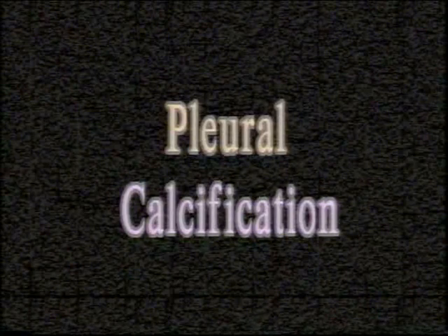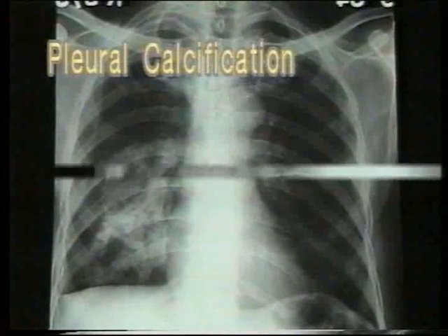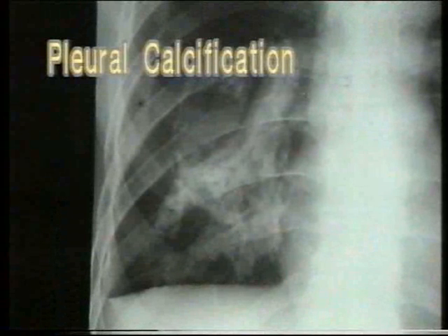An after effect of a pyothorax is pleural thickening and in some cases pleural calcification. Note the irregular dense opacity in the right mid and lower zone. It is denser than the bone and is distributed irregularly. This is a typical shadow of pleural calcification.